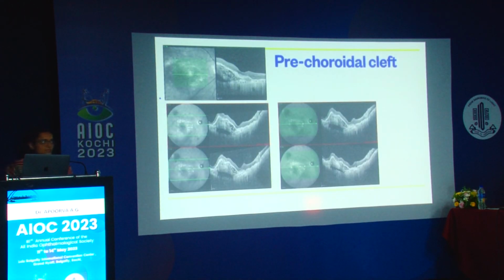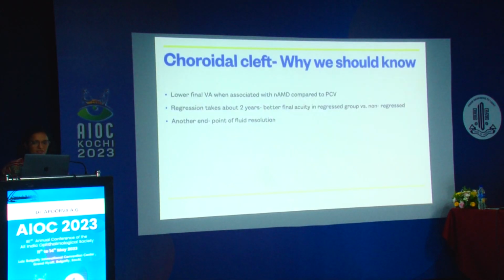So this is my patient. This is my case of multilayered PED with prechoroidal cleft, who usually does not present with retinal fluid, but after injection, since he is one-eyed, the choroidal cleft changes.